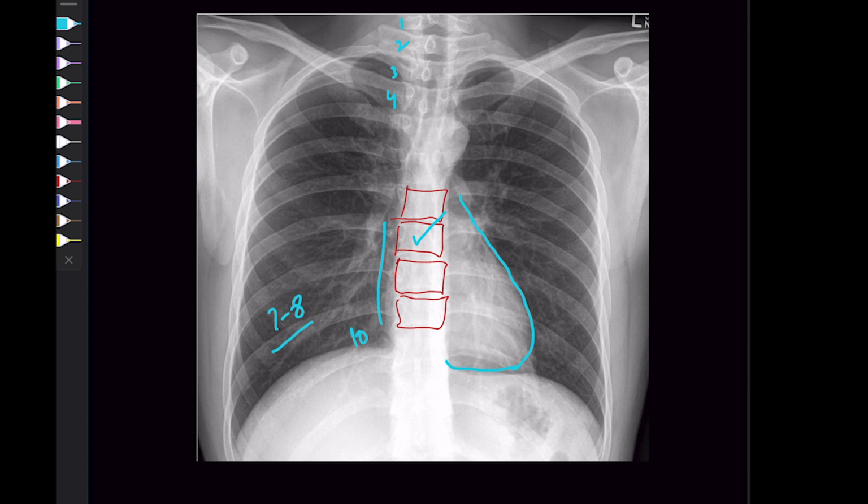And the third factor, we should look for is rotation, that is, what is the status of the patient. For that, we need to look at these clavicles. I'm sure everybody can see the clavicle on both sides. Let me draw it for you. And then what we have in the middle is the vertebral body. And there we should be looking at the spinous process. If it is in the middle, it means everything is fine and there is no rotation.